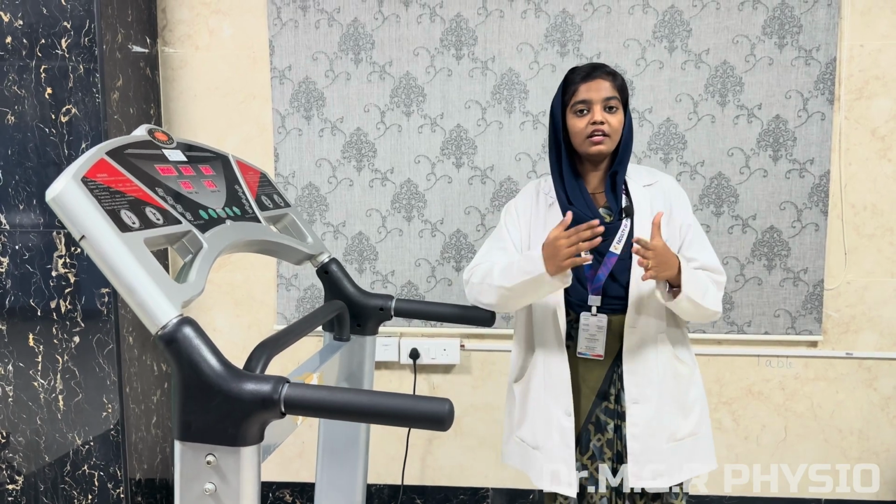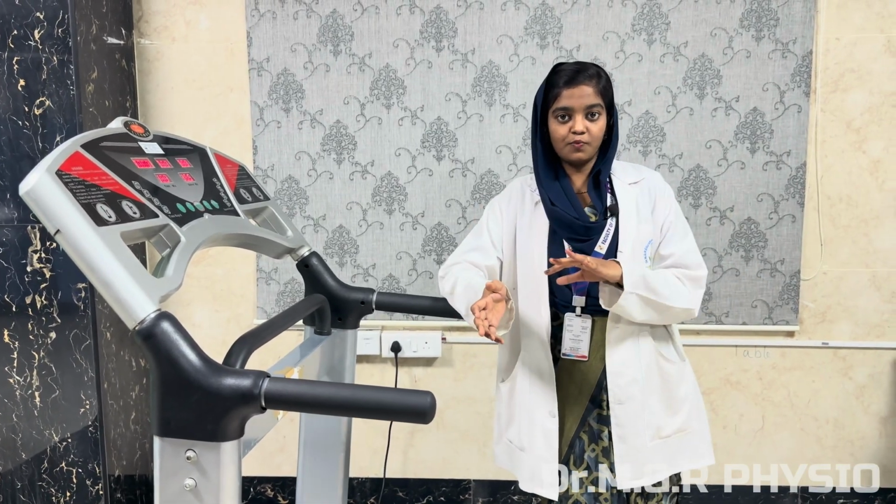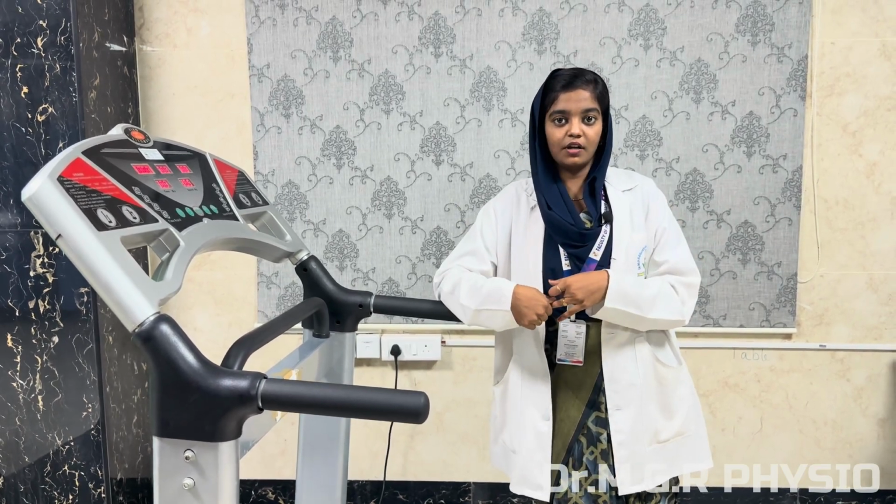Physiologically, due to these vibrations, blood circulation increases, lymphatic drainage increases, cardiovascular endurance increases, and muscle strength increases. This also boosts immune power. Due to these physiological responses, indirectly the muscle strength and muscular endurance are improved, and there are various changes in the body that are helpful for body fitness. This also increases joint stability and mobility.